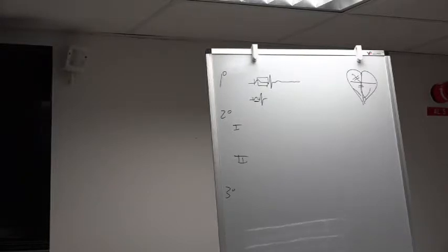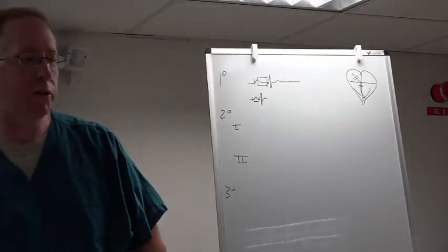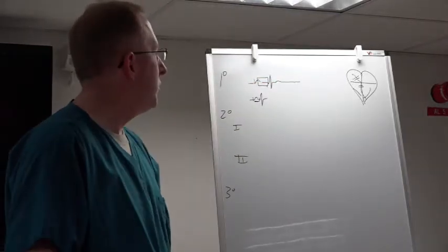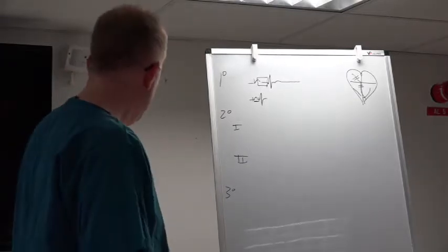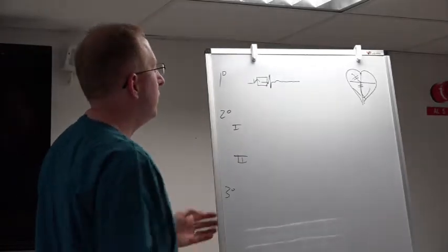So that's on page 121 of your book. The strip A is your first degree, right? So you can see that the PR interval is a little bit bigger than one big box. And the important thing is it's the beginning of the P wave, not the end of the P wave, to help you determine that. But most likely that's not going to be in your test, and you just kind of know it exists, but you probably won't see it on a test anywhere.